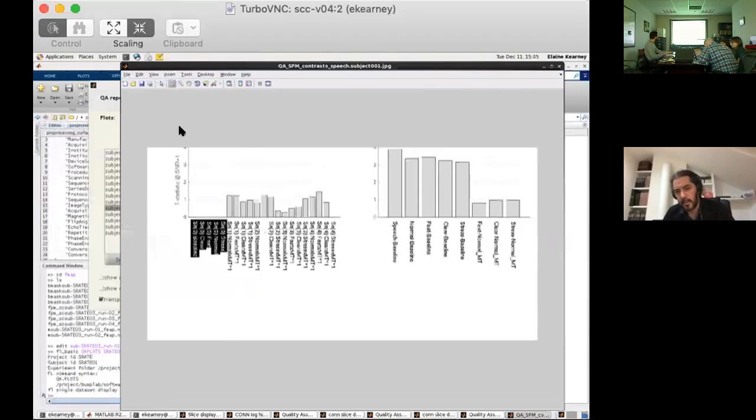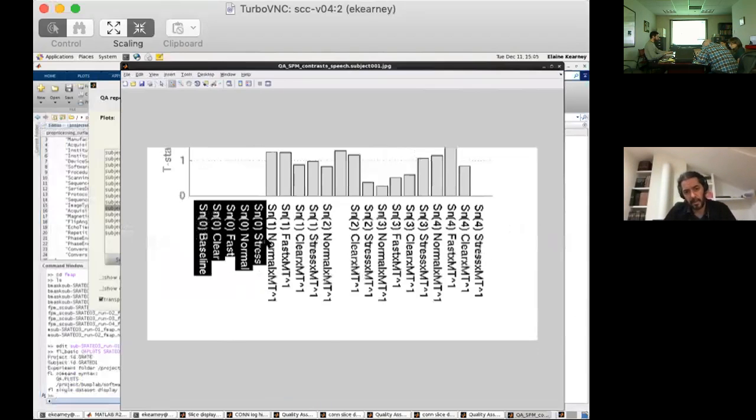Is it related to having less data for that comparison, or is it the control actually removing a lot of the variability? We could tell that by creating a design that doesn't control for that and looking at the same design analysis plots, and looking at the sensitivity of those contrasts. Because this is actually not telling you anything about the data itself, right? This is only looking at the design matrix, and it's figuring that out from the design matrix.